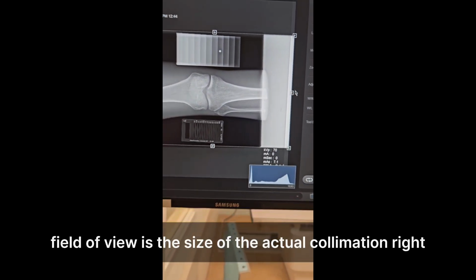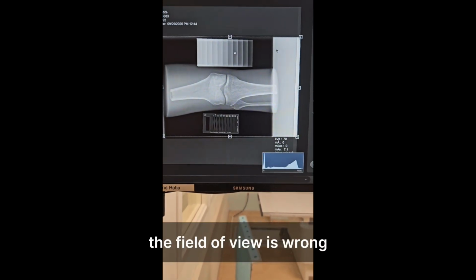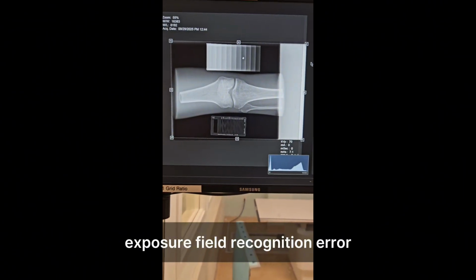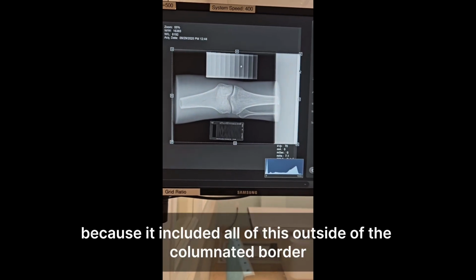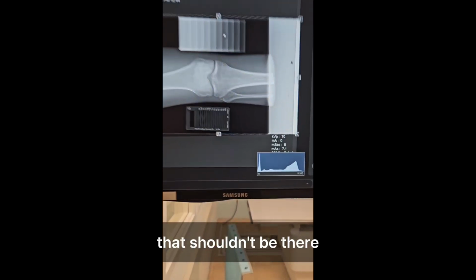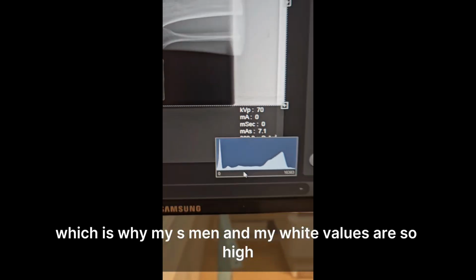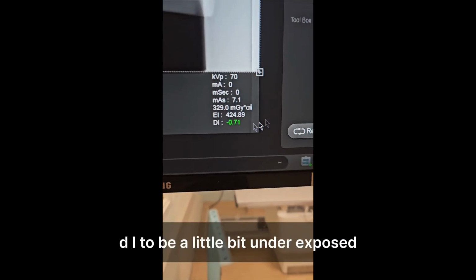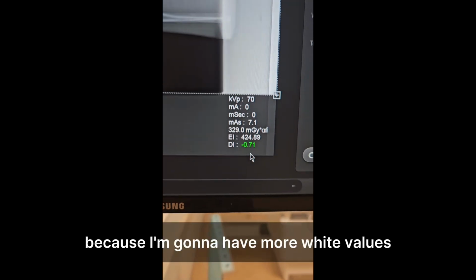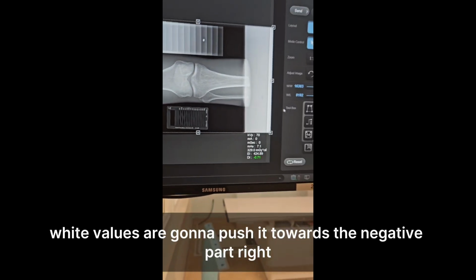Field of view is the size of the actual collimation, right? The field of view is wrong, exposure field recognition error, because it included all of this outside of the collimated border that shouldn't be there, which is why my smin and my white values are so high, which is causing my DI to be a little bit underexposed because I'm going to have more white values. White values are going to push it towards the negative part, right?